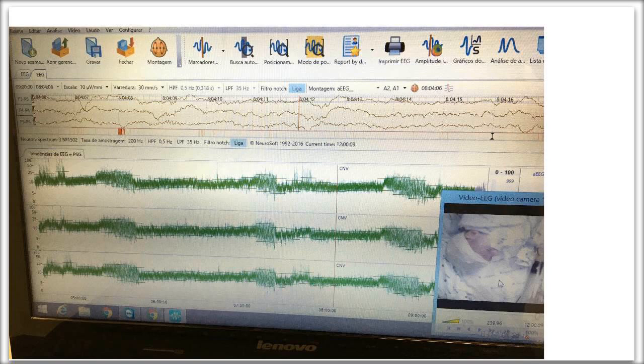So just in summary, the first case for the 28-weeker had lower than expected voltages for age, and certainly had some areas that seemed suspicious. The pattern itself, if we just look at pattern and we don't look at the EEG, is extremely worrisome. The pattern with the disruptions that are happening frequently, based on the history, certainly makes this baby very much at risk for seizures. So I wouldn't have hesitated to get more assessments, get more information, as well as a consultation with your neurologist about the benefits versus the risk of treating a baby that's in that condition.